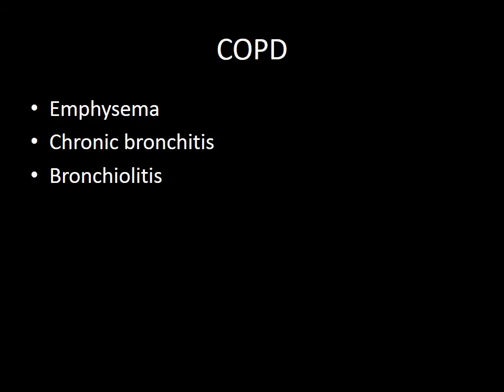Chronic obstructive pulmonary disease. The clinical syndrome of chronic obstructive pulmonary disease comprises emphysema, chronic bronchitis and bronchiolitis, which can be difficult to differentiate merely by clinical and physiological measures. Therefore, imaging is used to determine how much of the chronic obstructive pulmonary disease is due to emphysema.